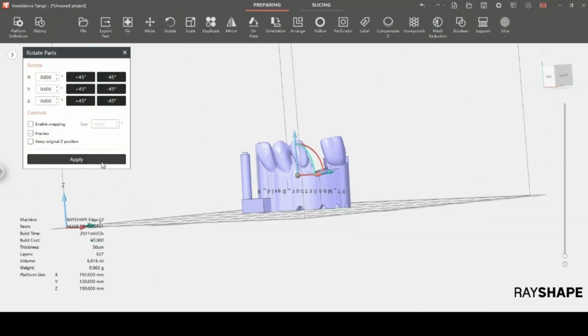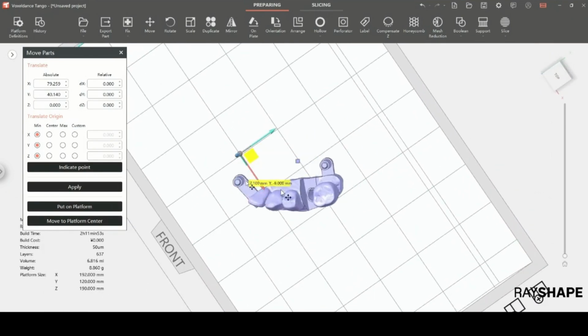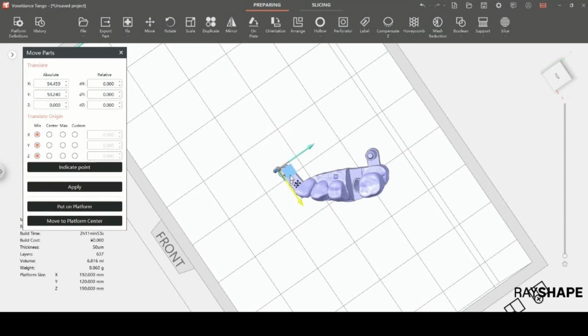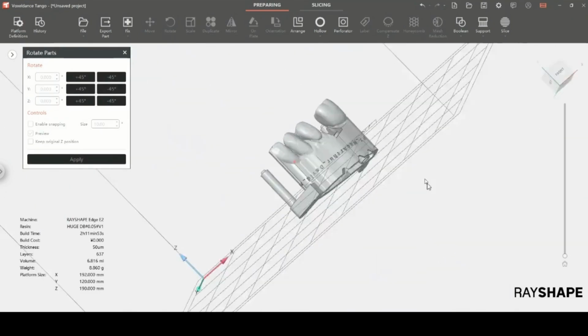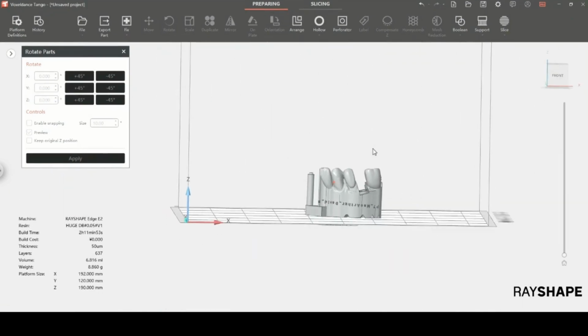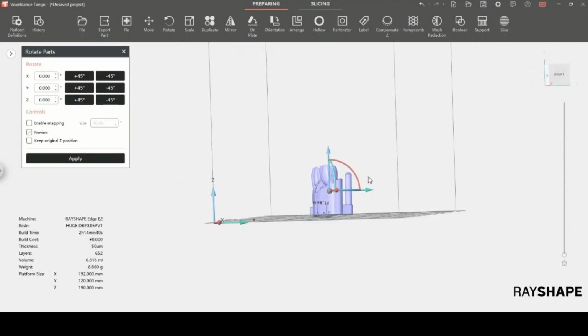On this one, we are rotating in different ways. You can either highlight the tubes that you can see on the screen, yellow, and move it. Now, if you click on the orb, the little ball that shows like a little shadow orb, that allows you to move it freely. So you won't move it in a synchronized movement. It will allow you to move it freely. So I would suggest you play with the software and see what works best for you.